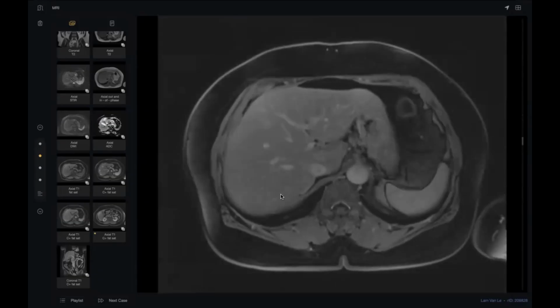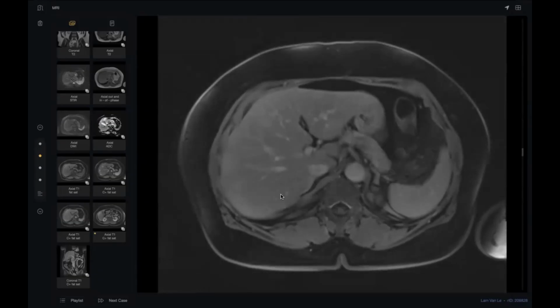So, what is your differential diagnosis? And by the way, they are multiple benign. What's your final diagnosis, doctor? Imaging findings of contrast enhanced CT and triple phase MR imaging are consistent with multiple hepatic focal nodular hyperplasia lesions. Excellent.